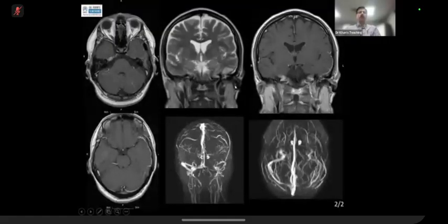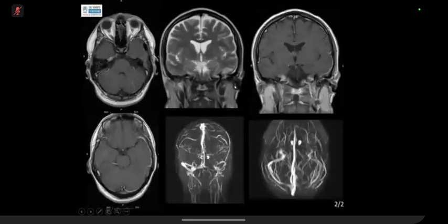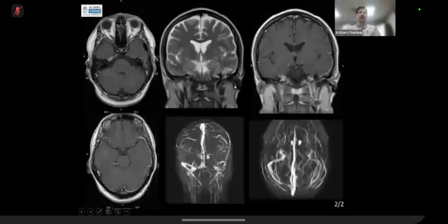First of all, look for dural enhancement. When there is dural enhancement, you know that the infection has gone into the dura, and subsequently it will go more into the parenchyma. There is a term which we use, cerebritis, which is a non-specific term. If you see here, there is edema, high signal. But as you were trying to pick up, there is no abscess formation. So once you see this, you just call it cerebritis. And you can see the main finding is that there is dural enhancement. There is some high signal, but there is no abscess formation.